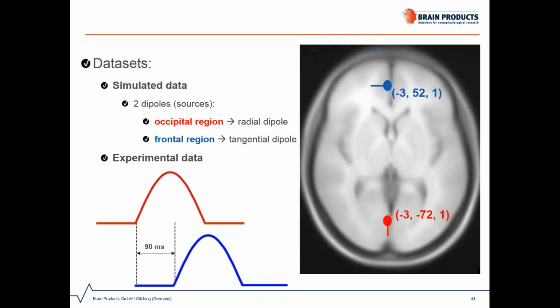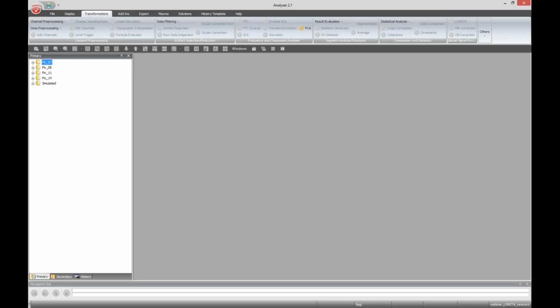So now let me start with this simulated data and demonstrate the LORETA module in Analyzer that combines the forward and inverse solver in one go. Okay, let me open Analyzer. And then I will open the simulated history file.